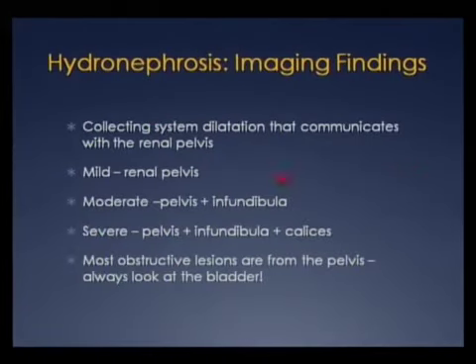Now, hydronephrosis. The hallmark of hydronephrosis is collecting system dilatation that communicates with the renal pelvis. And I try and make it easy. Mild is just dilatation of the renal pelvis. Moderate, the pelvis plus the infundibula. Severe, the pelvis plus the infundibula plus the calyces.